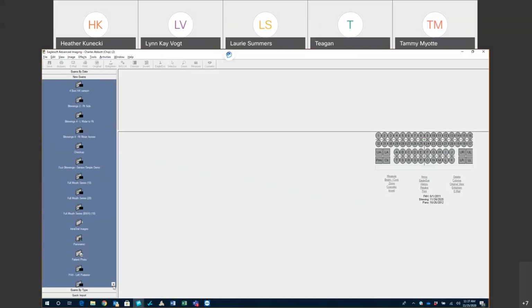You can see that there's a bunch of them. You can delete them. There are standard templates that come with Eaglesoft. So you guys had, was it Gendex sensors?